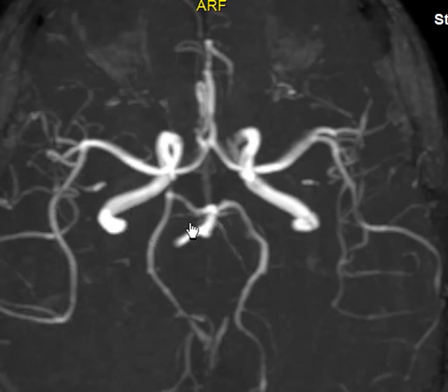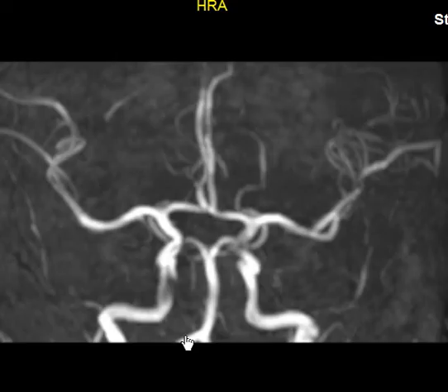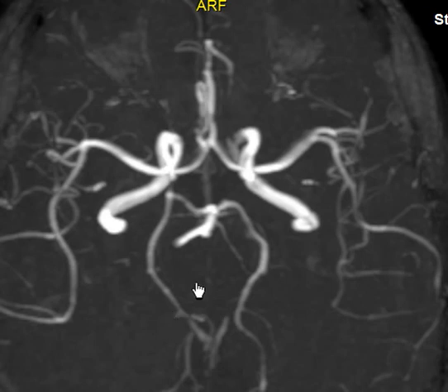You mean this? This is AICA, yes. And this is PICA. No, these are branches from the posterior cerebral. This is the posterior cerebral, giving these branches. This is the vertebral. These are two vertebrals joining the basilar. Most likely this is the AICA, yes. But PICA, I don't think it's here, from the vertebral. Okay? But it's not easy to be certain of it.